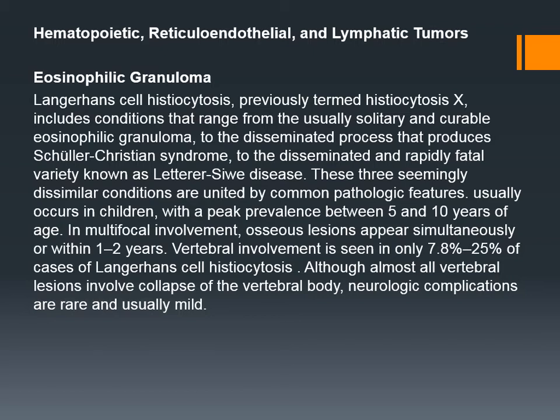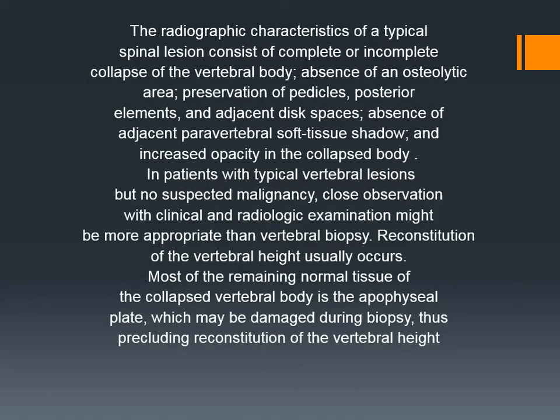So this is a very interesting thing. All vertebral involvement results in collapse, producing what is called pancake vertebra. But surprisingly, neurologic complications are rare, and where they happen, they are mild. Vertebral body collapse with mild symptoms, it's very interesting.